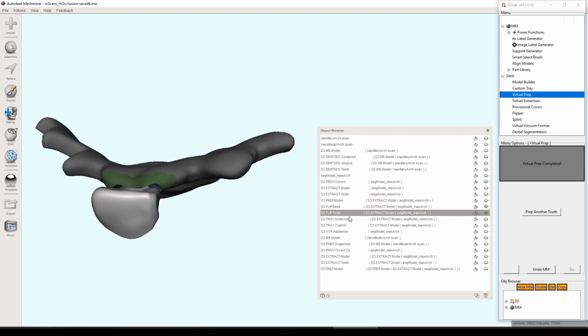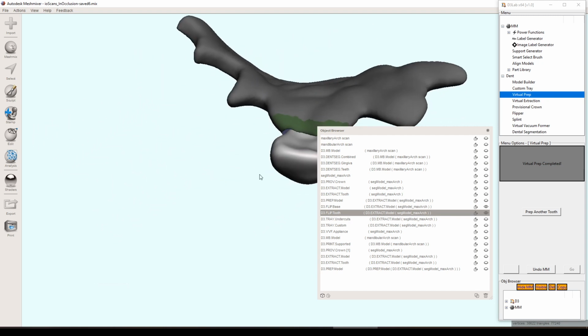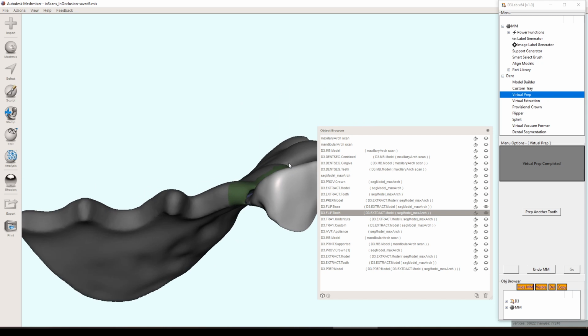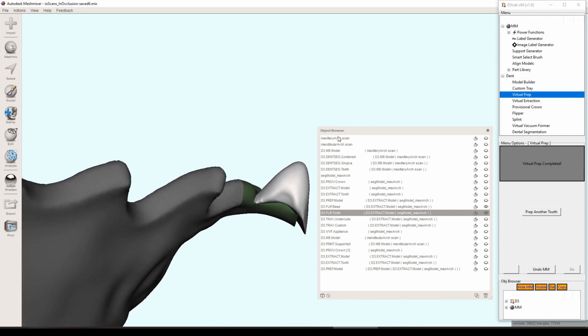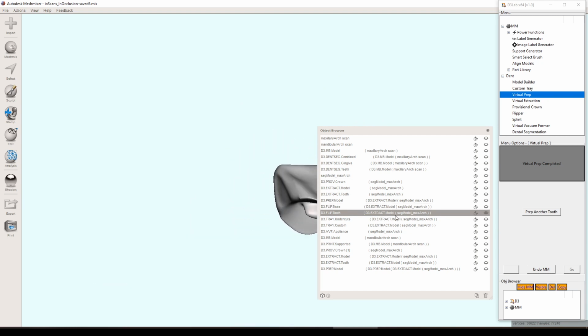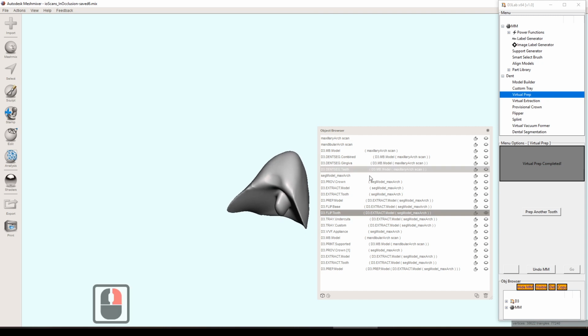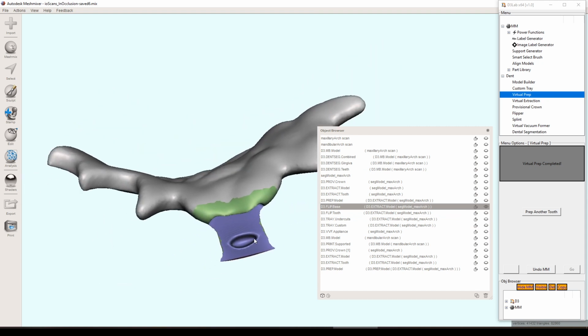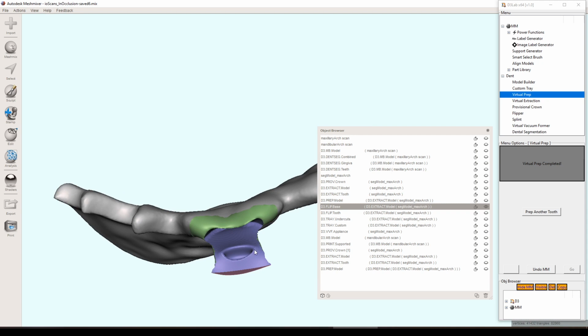But it not only generates the 2 pieces, it generates the 2 pieces with an offset just enough so that you can bond these 2 pieces together. There's a little spacer gap there. And beyond that, if you look at the underside of the tooth that's generated, it's got this little protrusion that helps snap into the base on the other side. So this is the way that you generally fabricate these things. When you 3D print them, you don't cure them individually. You 3D print them, they're in their green state. You add the resin at that point, connect them, and then cure the whole thing as one.